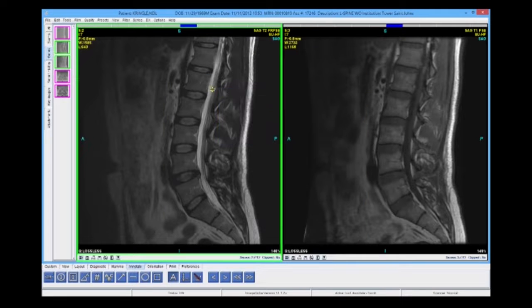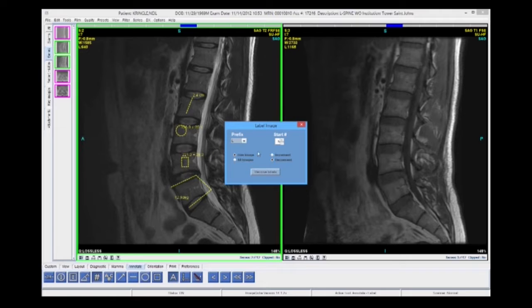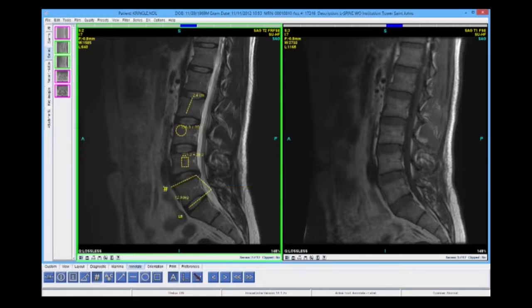So in this case, I go from a scroll, select the M key, go to a line measurement, select the M key, region of interest circle, followed by region of interest rectangle, followed by Cobb angle, and then finally spine labeling. And each of these modes are changed simply by pressing the M key on the keyboard, and it will cycle through back to scroll once I've completed my spine labeling.